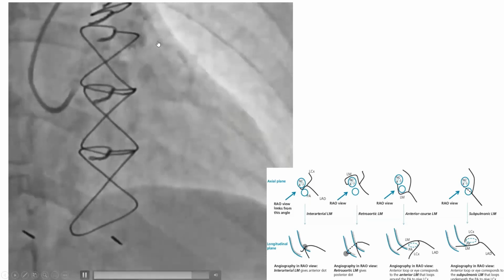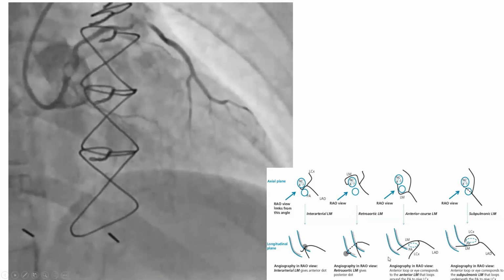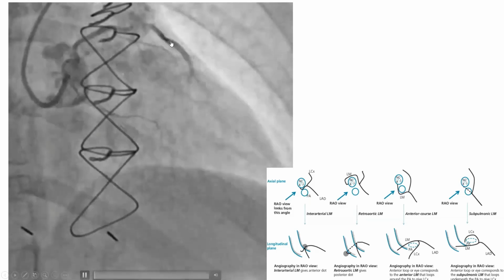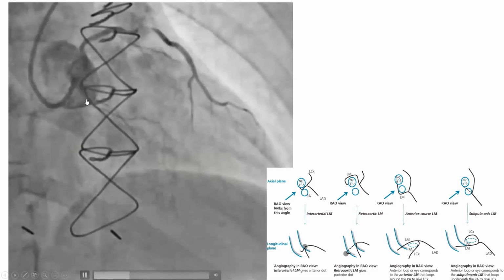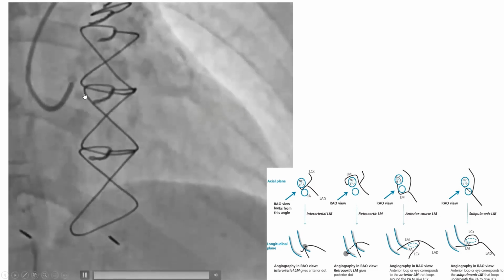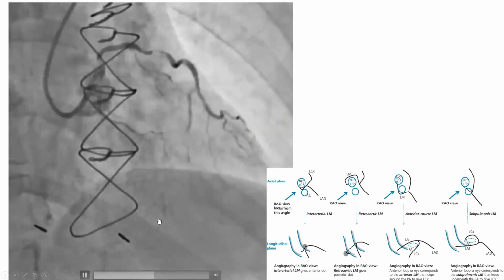It's a nice, wide, ample, smooth loop. So this is more this. This is what you see, a wide, upward, smooth loop. This is a pre-pulmonic course of that anomalous LAD. Now, notice here another important idea. So, three things. One is anomalous origin from the right cusp. Two, anomalous course. You define the course: interarterial, posterior, etc.